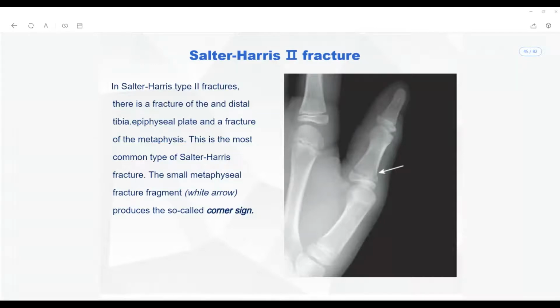You see here, when you compare to the other epiphyseal plates, they are almost securely present, where the provisional zone of calcification is quite visible. You see here there is a very thick hyperdense line. That's the reason which says that the provisional zone of calcification and the zone of ossification are actively involved, but I don't see such signs at this end. So that's the reason why I call it a fracture.